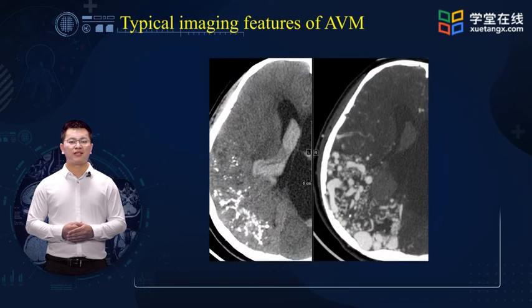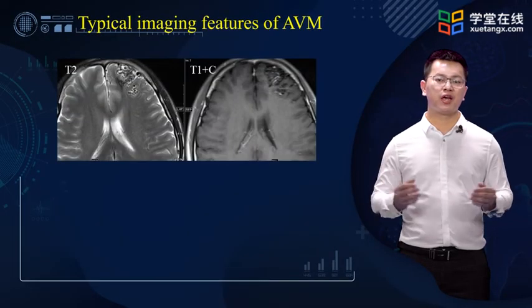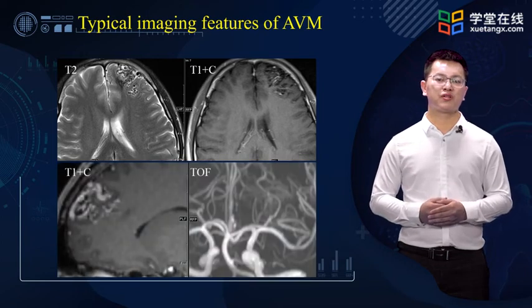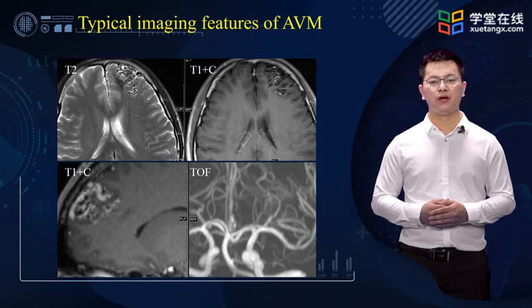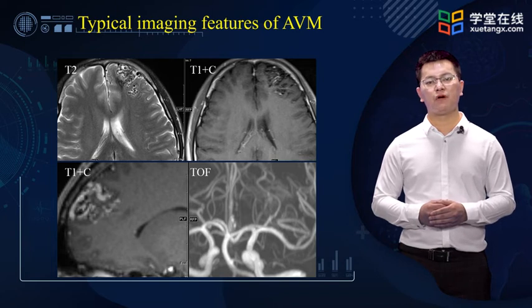These images show a classic cerebral arteriovenous malformation. Note the nidus with intranidal aneurysm and enlarged feeding arteries with a pedicle aneurysm. Contrast-enhanced CT shows strong uniform enhancement, whose shape configuration is typical. Flow voids with low signal intensity are demonstrated on the T2-weighted image, with enhancement post-contrast of both the lesion nidus and a large draining vein in this frontal lobe lesion. The 3D TOF MRA demonstrates flow in both of these compartments together with enlargement of feeding branches from the ACA.